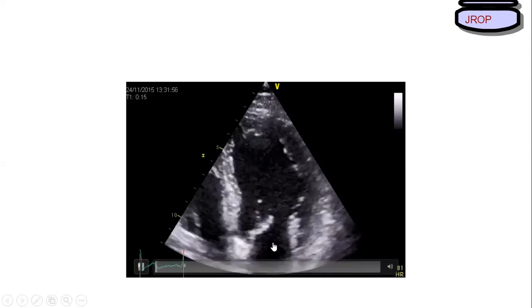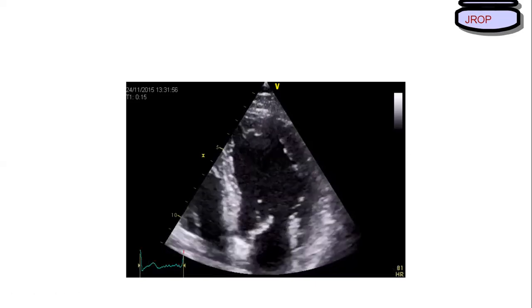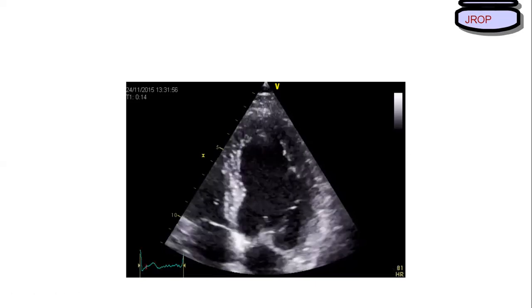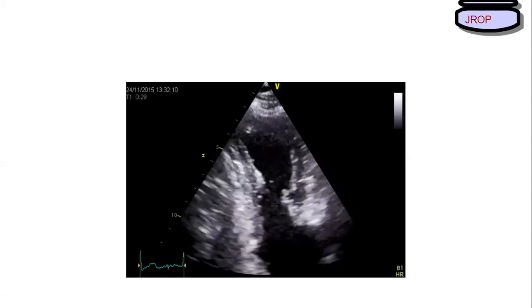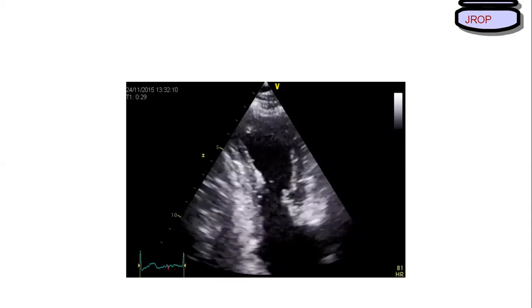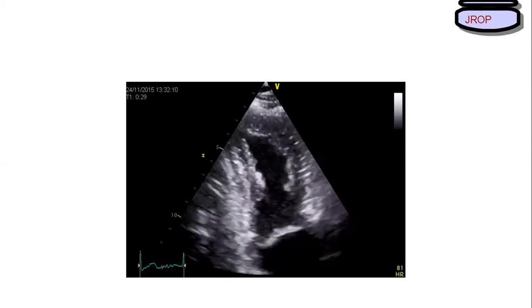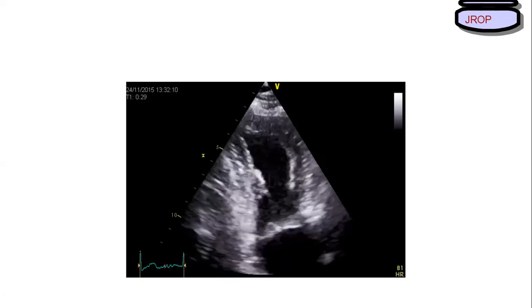And you see the bowing of this PML over here. Yes, sir. Again, circumflex. But sir, if PML is going toward LA, then it will not be flail. We'll come to that topic, flail, and I'll take a class for flail and this prolapse.